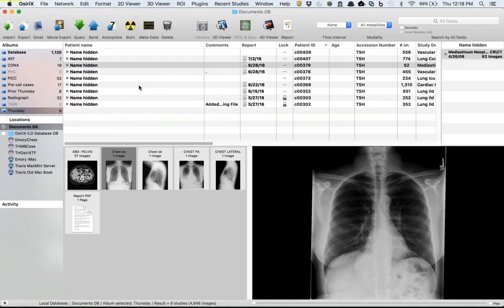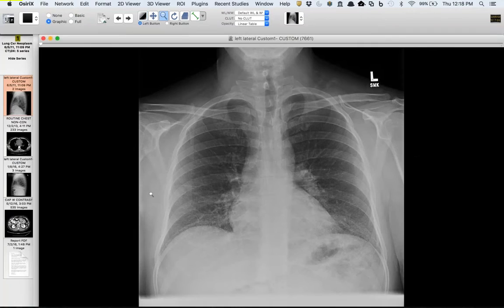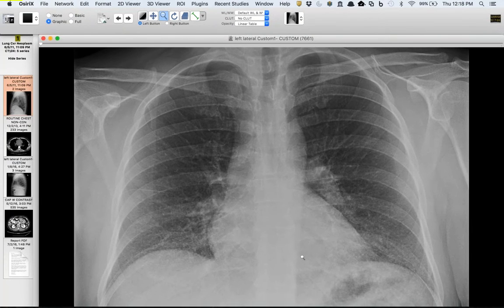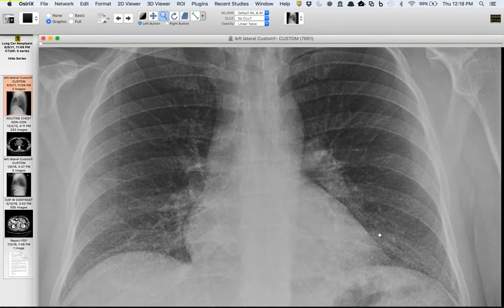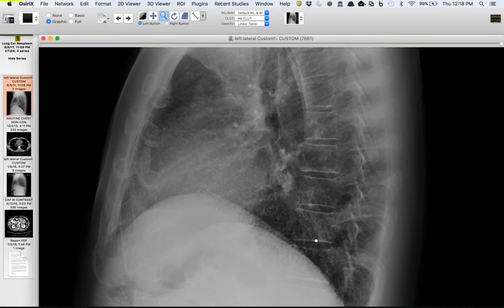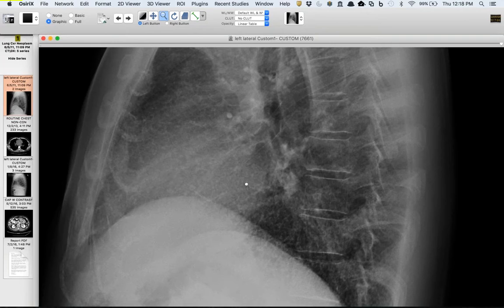And then this one is one I saw last week that is just, again, a really fascinating example of this. And this is one of those radiographs. The guy's not taking the largest breath you've ever seen, but I would still argue that they're very fine little nodular opacities, and they're almost miliary, but they're just tiny micronodules in predominantly the lower lobes, and you can see them better on the lateral, I think. At least that confirms that it's not just him not taking a big breath.